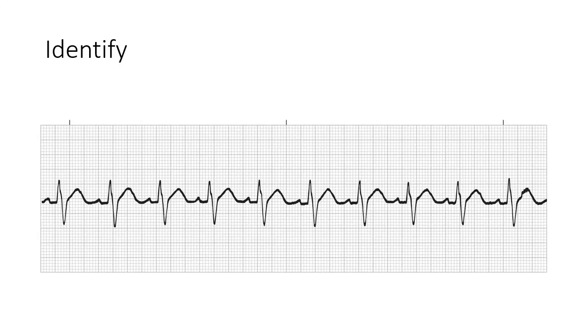It has a rate of 80, and that's just the first thing that I noticed because 2 of them are outside of that. Good catch. Otherwise, it would be a rate of 100. The P waves are upright, and you can notice them all. It looks about a normal PR interval. There's a QRS with every P wave, and vice versa. QRS looks about right. T wave looks a little long, but that doesn't really affect anything. To my knowledge, it just looks different.